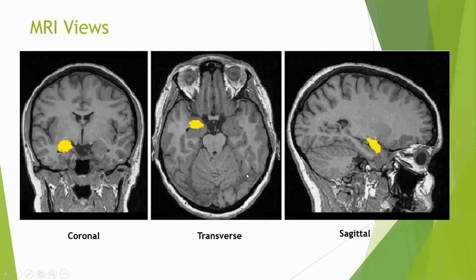For the shoulder joint, it's transverse and sagittal, in some cases coronal, especially if there is anterior shoulder pain which you are not able to treat conservatively, then you have to do a coronal slice to actually see what is going on, right? So, but overall, out of the 3 views, you actually need 2 views to understand what is going on.